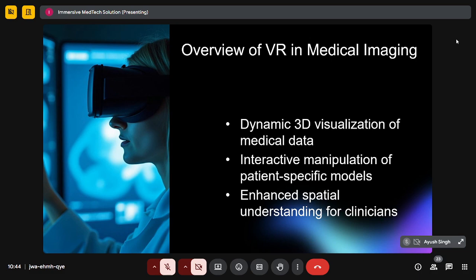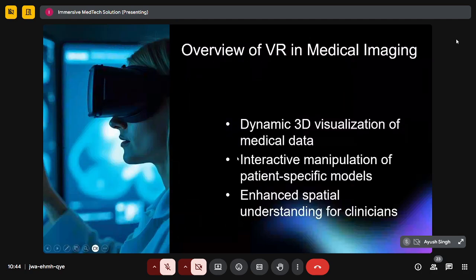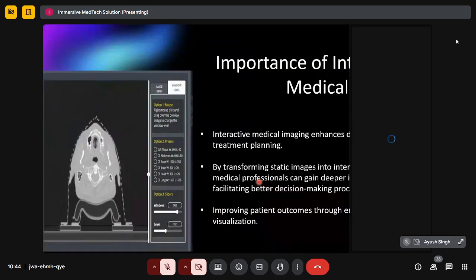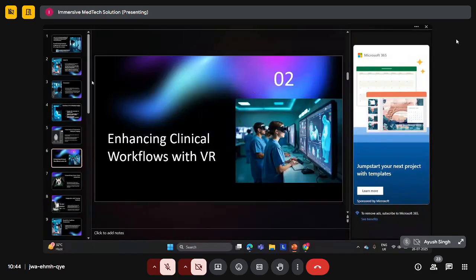That's the printing cost. To reduce this cost, we can directly load the data set in our viewing section, and once we are cross-examining the data set, we can easily modify the region and work on it. Once we are working on it, we will have greater knowledge about whatever tools are being presented. Then, coming to the next slide, is the importance of using this interactive tool in medical planning. Once we have imported the result over here, let me go over that.